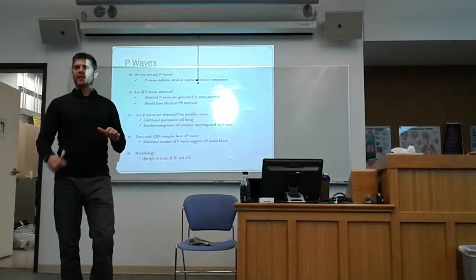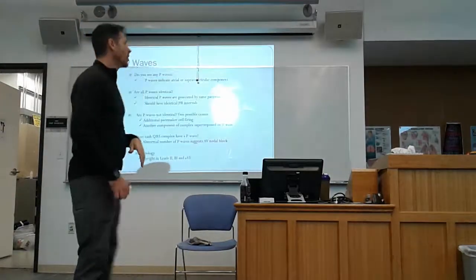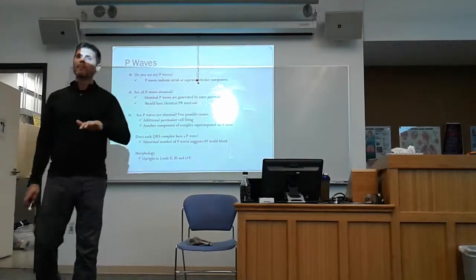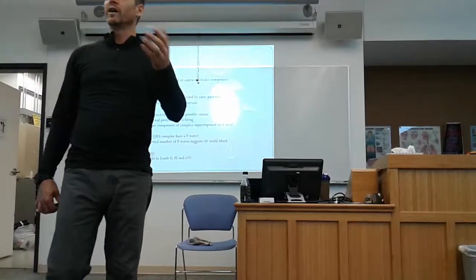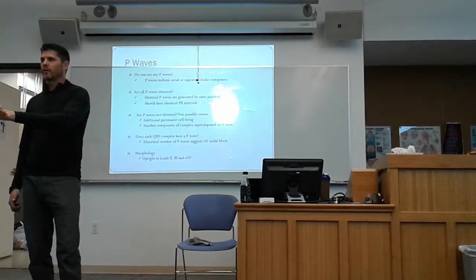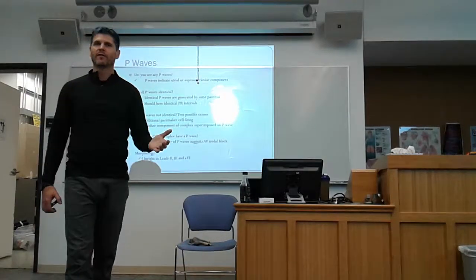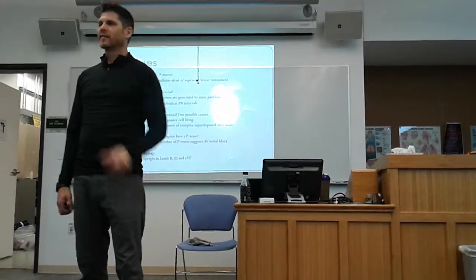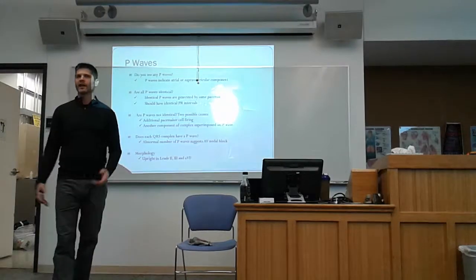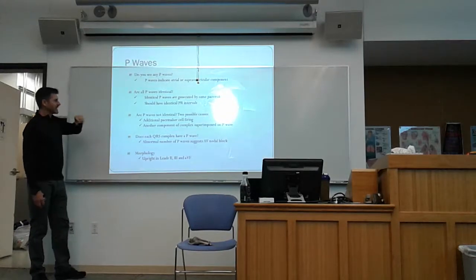We're also going to look, I realize that the PRI comes later, but remember we've got some crossover of things. So I want to know, do my PR intervals all look the same? I'm not establishing that number just yet, or in the future you'll be able to do a number of these things at once, but I'm not really caring about the value of the PR interval right now. I want to know that the PR interval is the same. The fastest way to find out that my PR interval is the same is to do what? Calipers. Set your calipers at the PR interval and see if they're all the same. No, they're not all the same. Okay, great. So I'm looking at my P waves if they're identical. I'm looking at my PR intervals if they're identical.